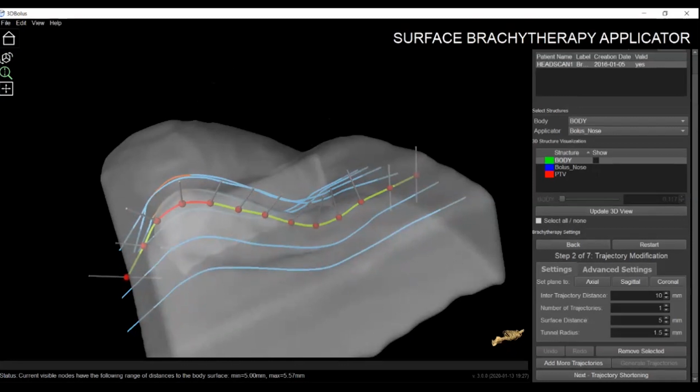So our module is the only piece of software that has the ability to show you whether a piece of curvature on any of the trajectories has a radius of curvature less than a minimum set threshold, which is a big safety feature, before you ever go to the afterloader and use a dummy source or a radiation source to go through.